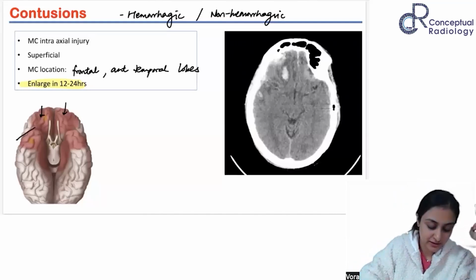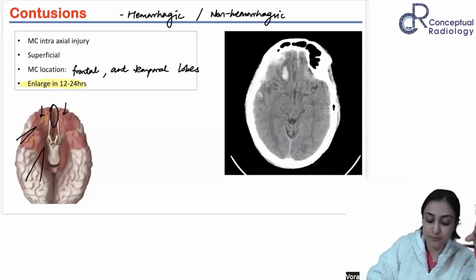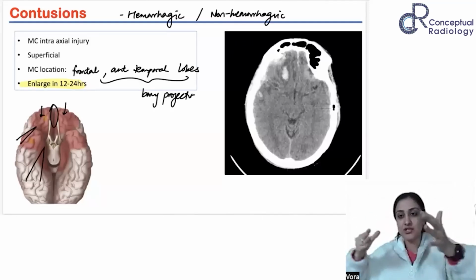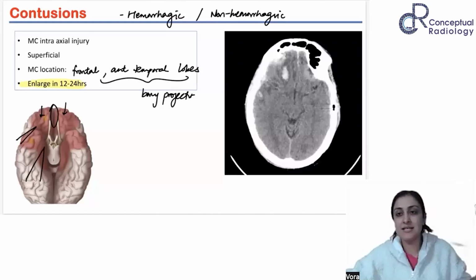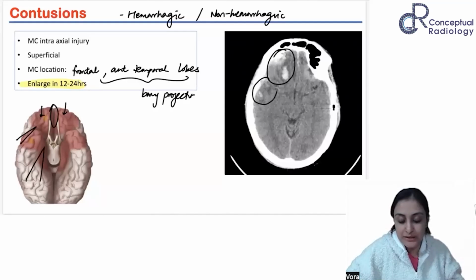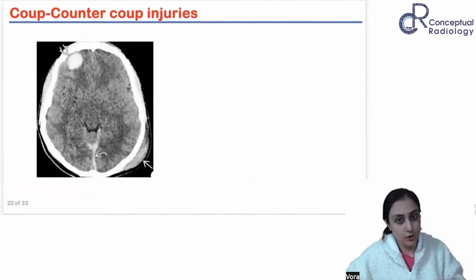Here you have the sphenoid, you have the petrous apex coming in, you have the cribriform plate here. So all of your bony skull projections are here. Anytime you have a trauma, anytime there is a closed compartment injury, the brain shears against these bony projections and you have these hemorrhagic contusions more commonly in the frontal, basifrontal, and anterior temporal lobes.